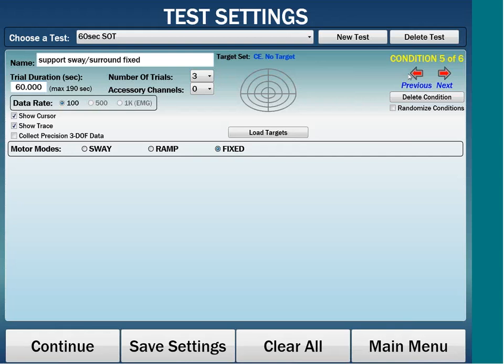You can choose decimal precision from 1 to 5 decimal points, data delimiter, and file types, whether you want all the data to be exported into a single file, or you would like each trial to be in its dedicated data file. So for the demonstration of the exported data, I will go ahead and select all of these. I will click Save. I'm going to go ahead and select Christina.